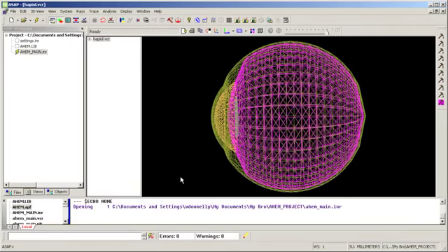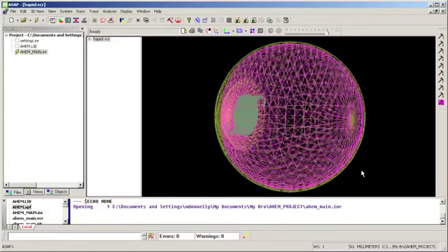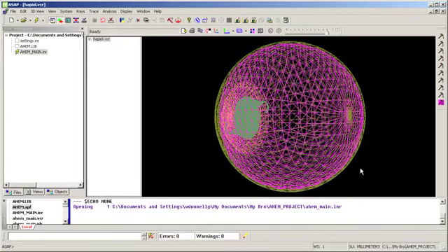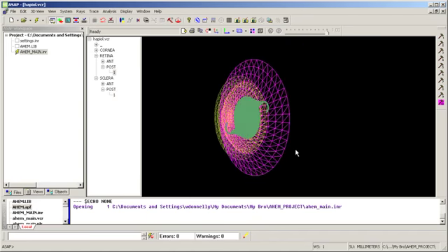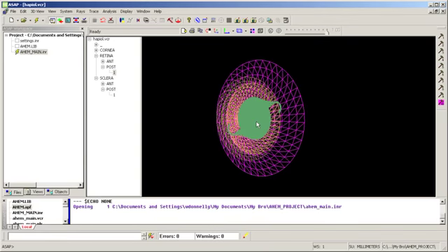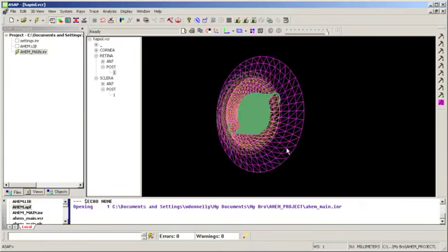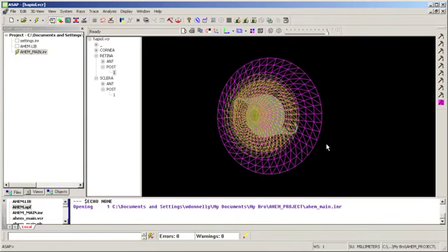We're going to use the eye model to model an intraocular lens now. And then we're also going to visualize the appearance of the intraocular lens from the outside, from the cornea. So let's look at that intraocular lens, which is inserted into the eye first. So I'm going to remove some surfaces here. I'm going to remove the sclera and the retina. And here's my intraocular lens in the green. And we see haptics around that lens, and this is the front of the eye.